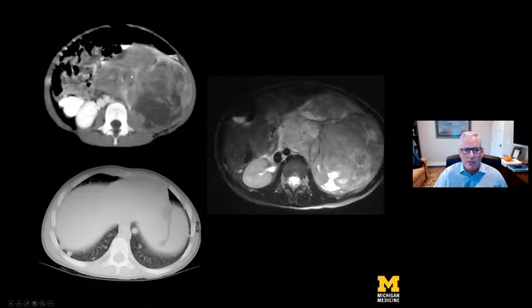As you can see, this tumor, instead of encasing the aorta, is displacing it and the IVC over to the right. We also see a little bit of enhancing renal parenchyma. We look for this claw sign to tell us that this was a renal mass that has broken out into the retroperitoneum. Regional adenopathy can be seen. This is the MRI of this patient. Okay, we can also look for liver metastases, and again, CT for pulmonary metastases.